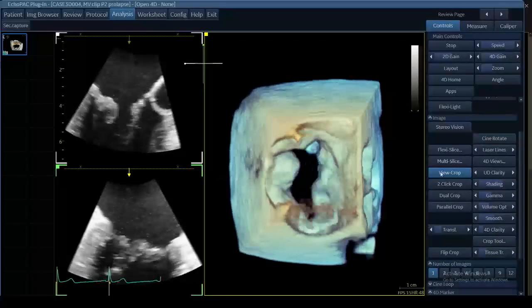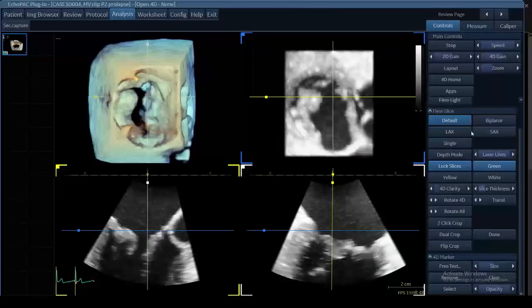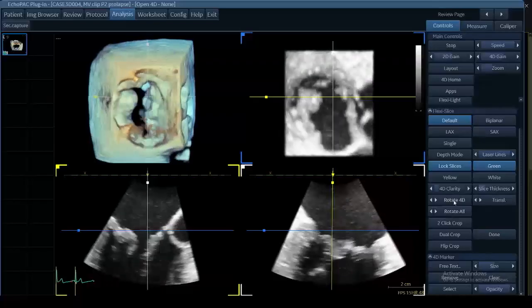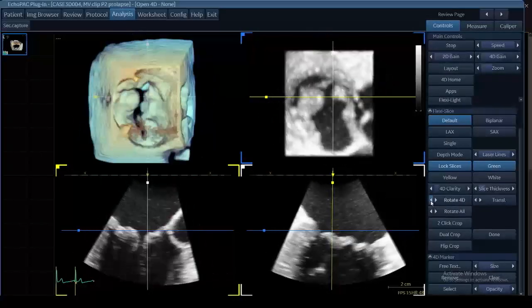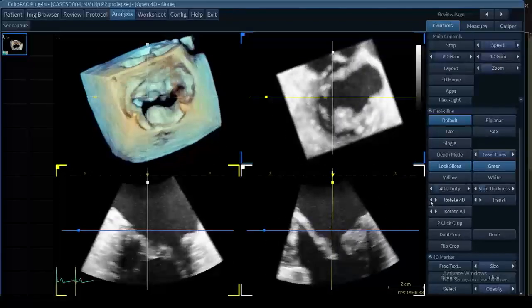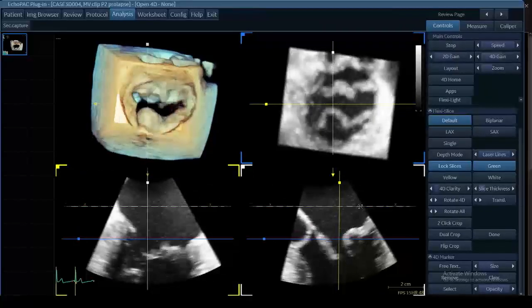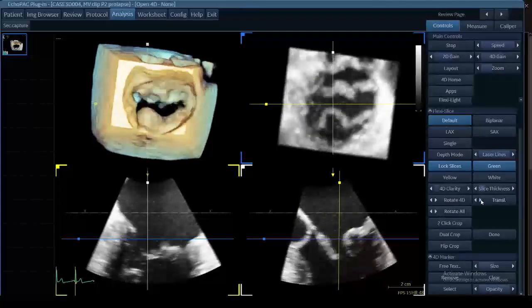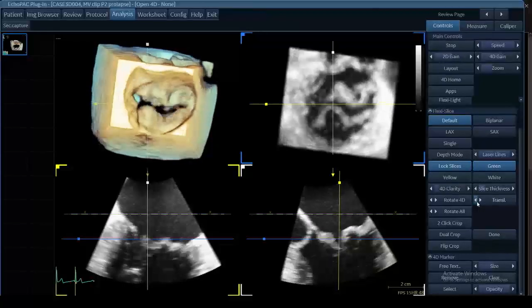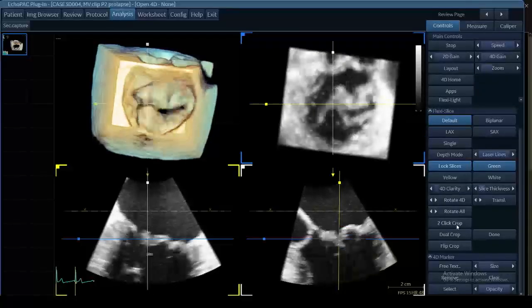Is your eye looking from the cropping to whatever color line is in between? Yeah, so when you're in this flexi slice, our cropping plane is that green plane. Our eyes are the direction that the green plane is from. If you do a two-click crop, then you don't necessarily have that cropping plane after you do your two clicks. And so then you can use the translate to adjust it back and forth.